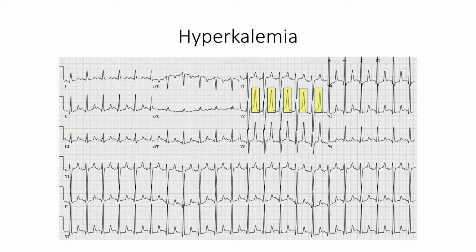precordial leads. The important thing is that in hyperkalemia, you diagnose this early, because worsening hyperkalemia can lead to ventricular tachycardias and can be fatal if untreated. So the ECG is a good way to screen for hyperkalemia in patients.